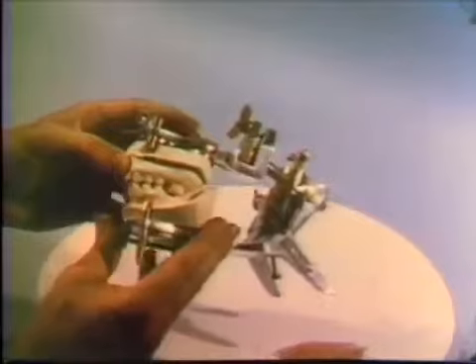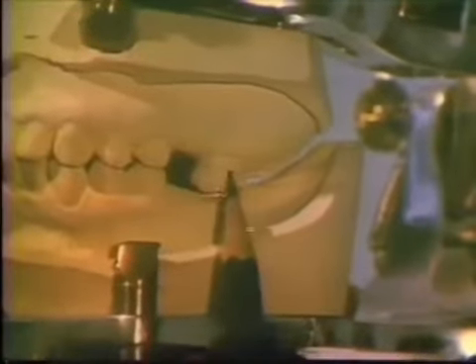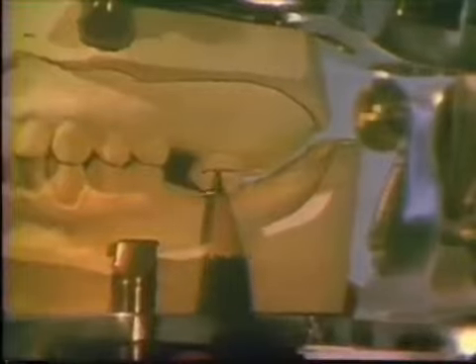Information which is achieved on the mounted study models and correlated with information from the oral examination will lead to the development of the diagnosis and the proper treatment plan. The level of the occlusal plane can be accurately observed, and recommended changes can be outlined on the study cast. The degree of occlusal reduction necessary to provide space for tooth replacement can be noted.